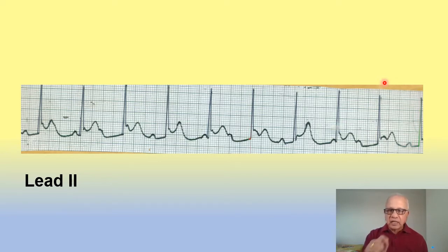Now the other finding in the ECG here, if you look very carefully, you can see there is an ST elevation here, right? Yeah, an ST elevation with the concavity directed upwards. What are the conditions which can produce that? Of course, the first thing which I am sure you would say is a hyperacute myocardial infarction, because we are giving you only one lead here in an arrhythmia. We can't say which is the infarction. It could be lateral wall, it could be inferior wall, whatever.